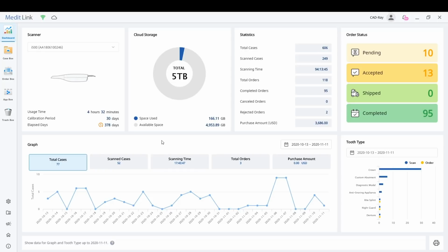They're saved there and synced across the cloud, so I can go to any other computer, log in with the same username and password, and have access to everything. Whereas I'd spent a lot of time searching for cases on the server, on a local PC, not knowing where I'd saved something and where I could find it.